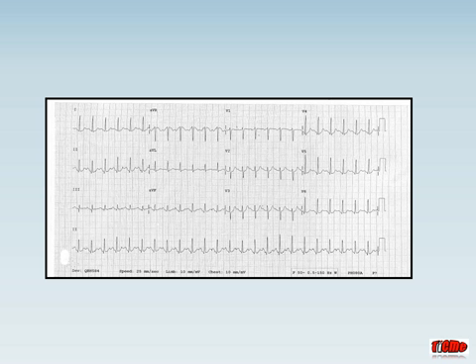Okay, let's look at this next ECG. It's a regular narrow complex tachycardia. Because it's regular, we're looking for P waves, and there are P waves before every QRS complex. Now that we know about RP distance, we're going to look at the RP distance, and because the P wave is more than 50% of the way from the R wave, we know this is a long RP tachycardia. Now remember that long RP tachycardias essentially consist of sinus tachycardia and atrial tachycardia.